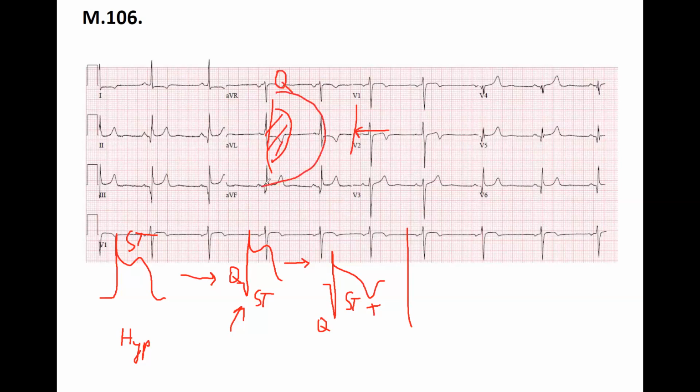This area that I have here, maybe I'm using a different color, that's the sign of the lesion. And if you get further from the coronary closure, this area is ischemic. So we have a sign of necrosis, a sign of lesion, and a sign of ischemia.